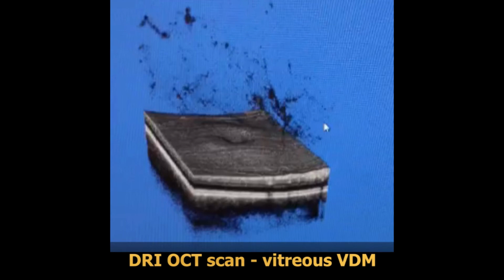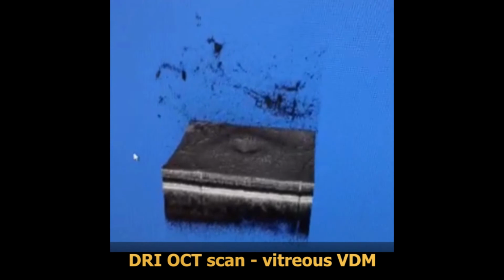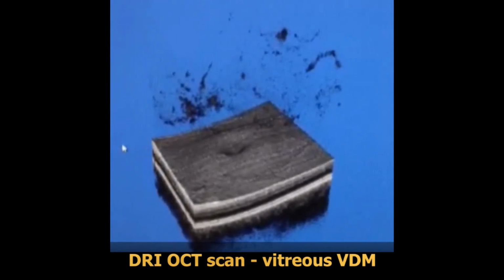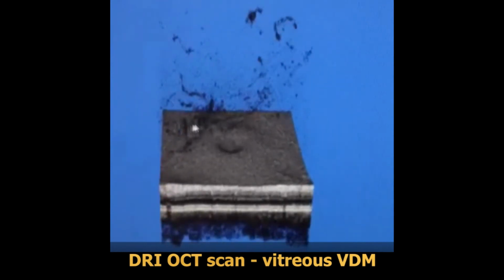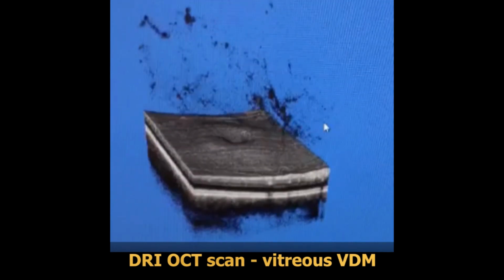And that would be very important for us to be able to better understand the disease process in patients who have vitreous floaters. Using light rather than sound more closely replicates the experience of patients with floaters and can image for us the structures that create the shadows that patients see as floaters.